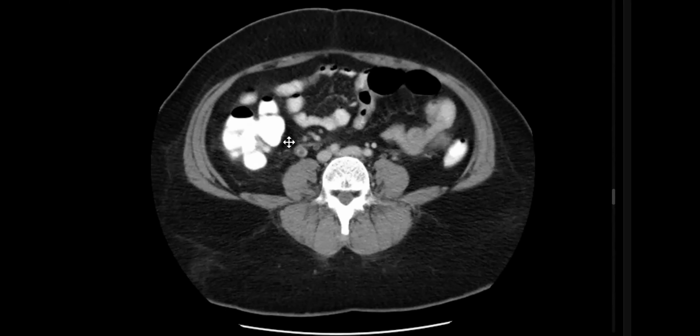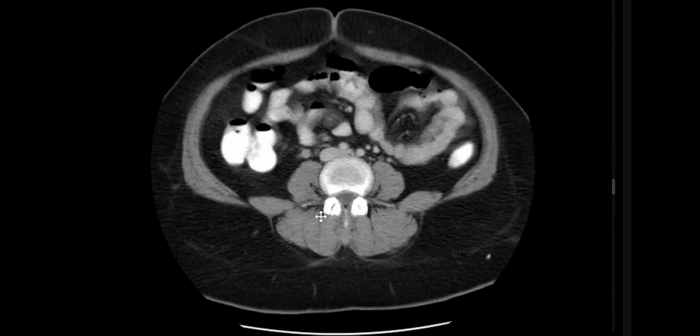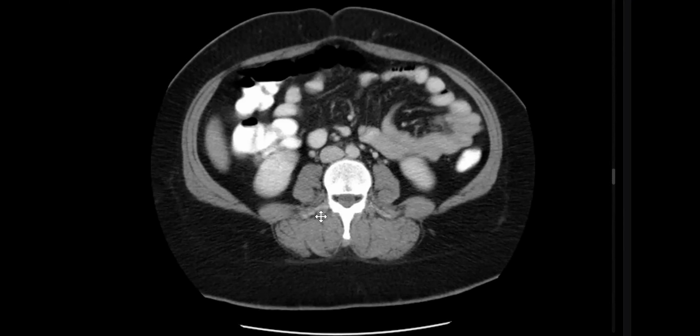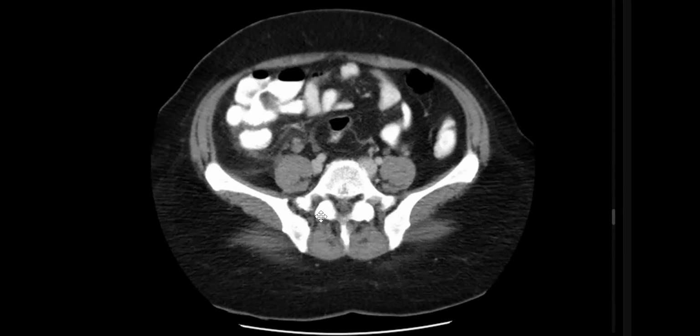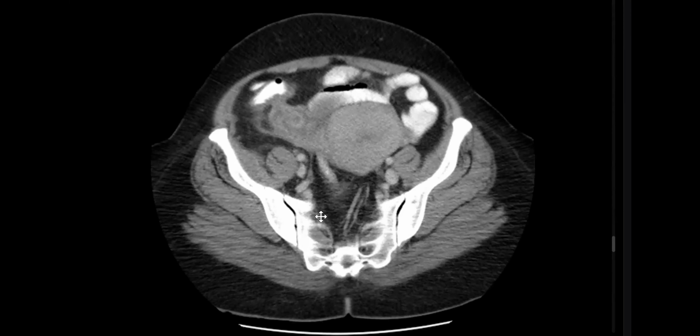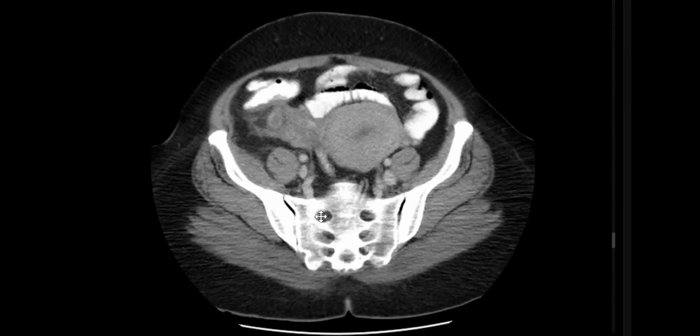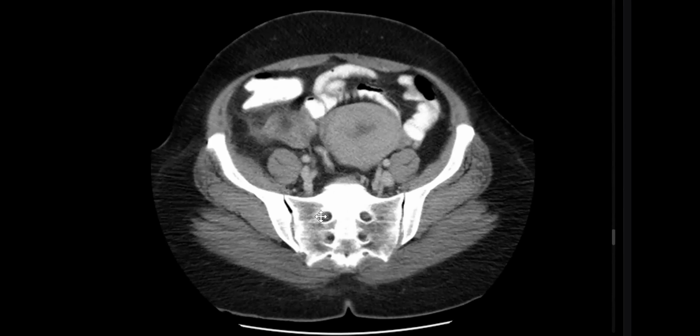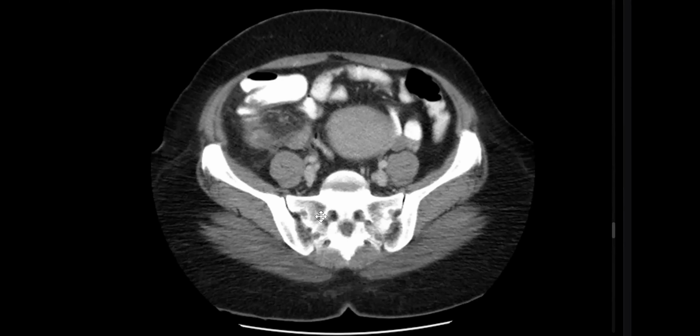I can see a thrombosed blood vessel here. Very good. Name this blood vessel. I think it's the ovarian vein. Yes, the right ovarian vein, thrombophlebitis. Very good, my friend. I'll give a comment later.